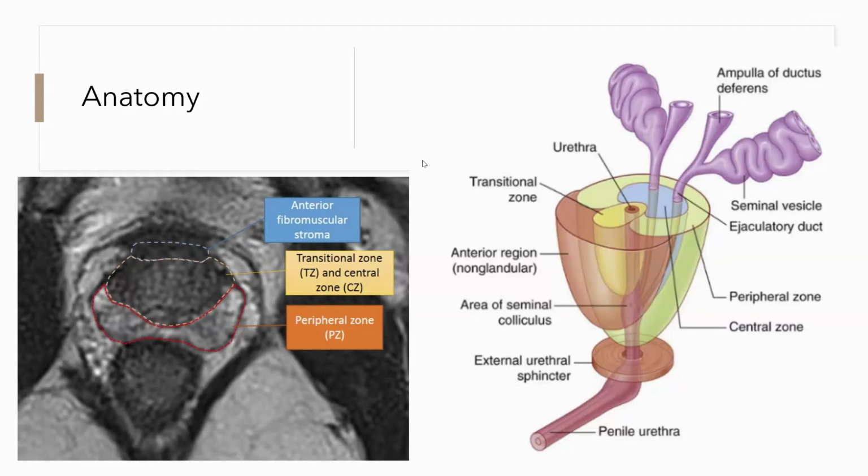We all know that just like rectal cancer, for a proper delineation of prostate cancer, we need to look at MRI images. And again, just like rectal cancer, the sequence that we are interested in is the T2 weighted MRI sequence. And again, diffusion weighted imaging is important. Dynamic contrast is important as a component of multi-parametric MRI images. But the most important thing for us as radiation oncologists is really the T2 weighted MRI image.